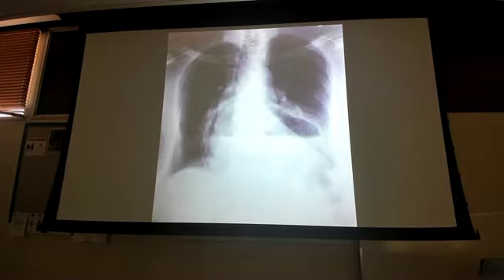Usually when they're this bad, it's usually trauma, right? And this isn't something that slowly happened. Sometimes the hiatal hernias can be very mild, like the other one that we've seen, causes some indigestion, causes a sense of early satiety, right, fullness, because the stomach is kind of sitting up there. But this is usually trauma. The whole stomach has come up through the diaphragm, and they are going to be surgerized to fix it.